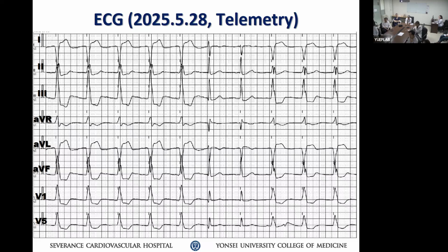If that's the case, if you imagine some sort of regular rhythm here, almost, maybe this is a flutter, sensitive with the regular QRS complexes. Then maybe this is the pacemaker sensing only the flutter every third or fourth beat or something like that. So that's another differential diagnosis we have to put on. So it possibly could be that, but not 100% sure.